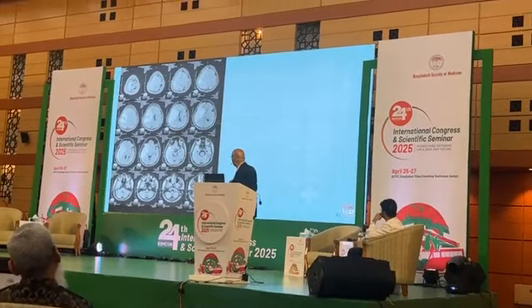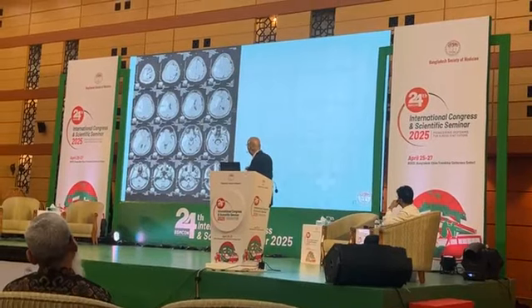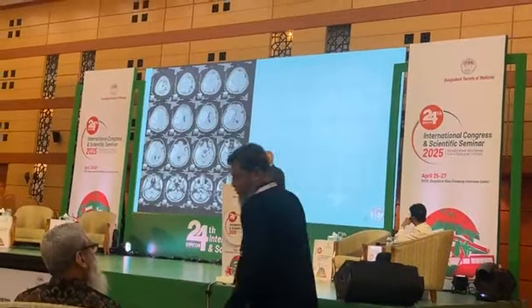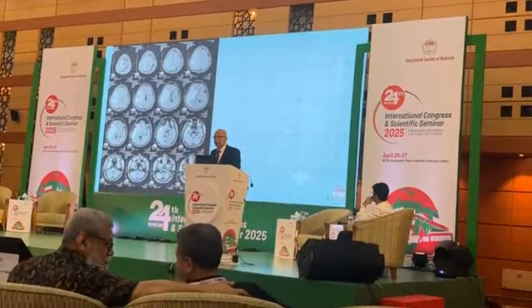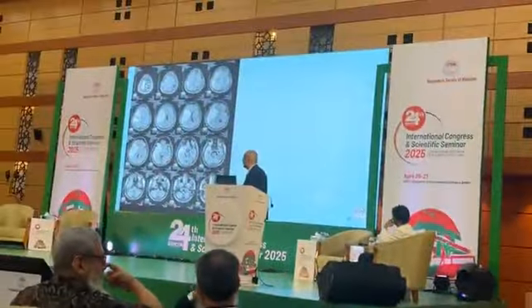Right, so just quickly, this is again right middle cerebral artery territory infarct. This is FLAIR sequence, hyperintense in FLAIR, white lesion in FLAIR. So we see lesions mostly white or hyperintense in FLAIR and T2 and hypointense in T1, or white, black.